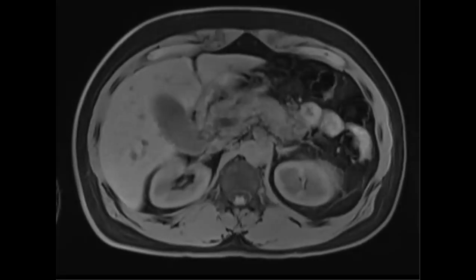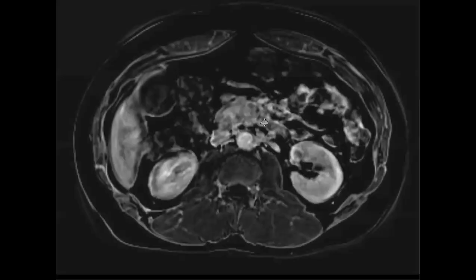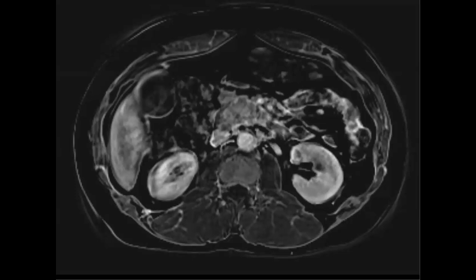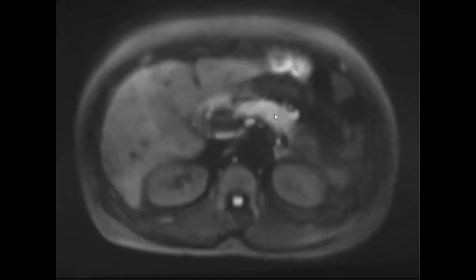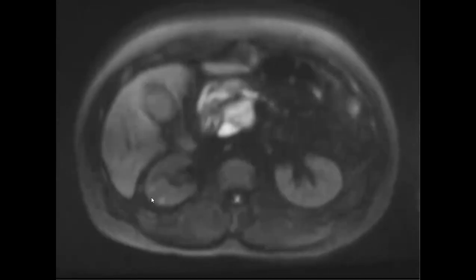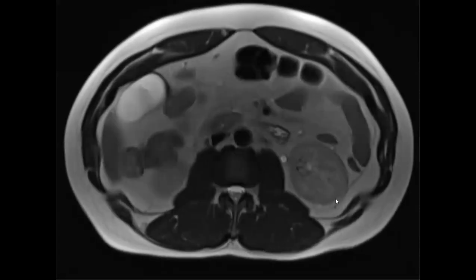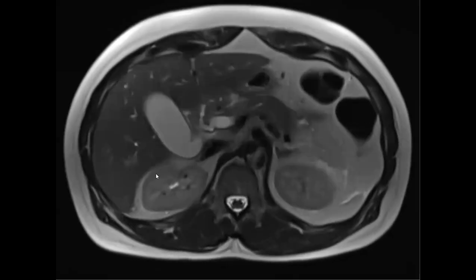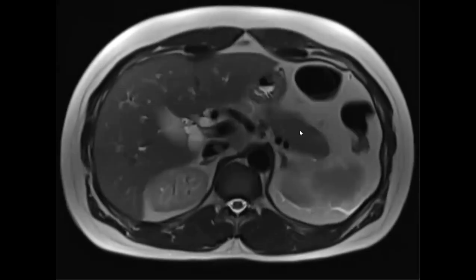A couple of other pertinent things. You always have to go look at the kidneys. You can see the whole pancreas looks kind of abnormal. In the kidneys, there were a couple of tiny cysts, but there weren't real lymphocytic infiltrates. And then you look for sclerosing cholangitis. Sometimes if you don't get any of that, it's hard to get the diagnosis via biopsy because they have to get big core biopsies. So often they'll just do steroids as a steroid trial and see if they improve.